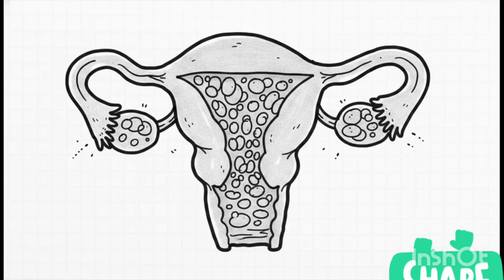It's also super important to realize that you aren't always just looking for one isolated leiomyoma. Patients very often present with multiple leiomyomas. When this happens, it can significantly enlarge the uterus and totally warp that nice, smooth, normal contour we talked about at the beginning. The sonographic landscape can literally turn into a complicated map of overlapping masses.